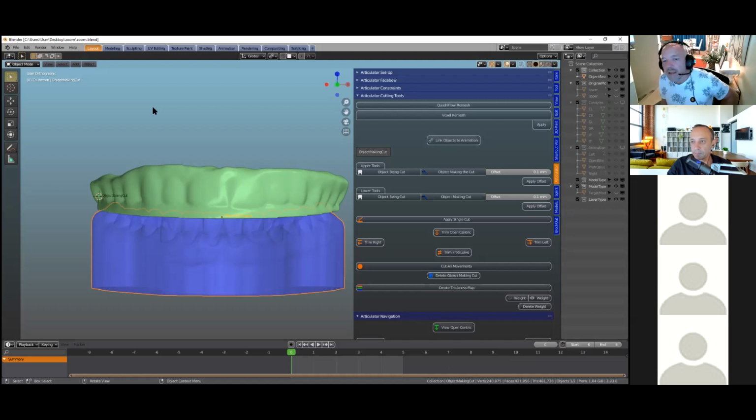Yeah. Look, it gives us flexibility as well, because with Boolean cuts sometimes there can be a situation, and luckily we haven't had many of those, where the Boolean cut will not work. So you're trying to trim all movements and then all of a sudden you see a hole in it or something. That's because the Boolean cut didn't work.